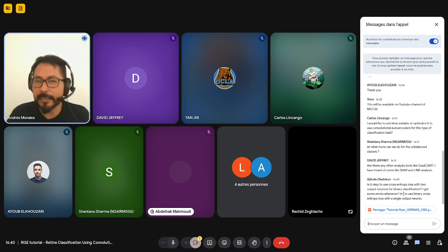The one that I showed here was the simplest one. It was just to give you a taste of what you can do with this kind of interpretability. Also the disadvantage is that you visually have to start judging, and it depends on every image. But there are a lot of methods that can be used.